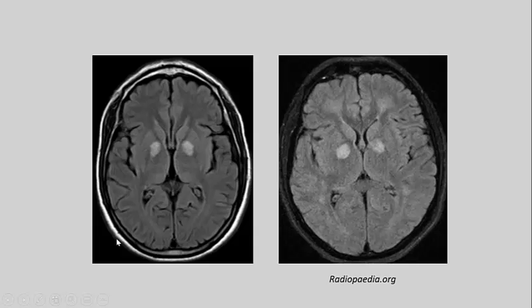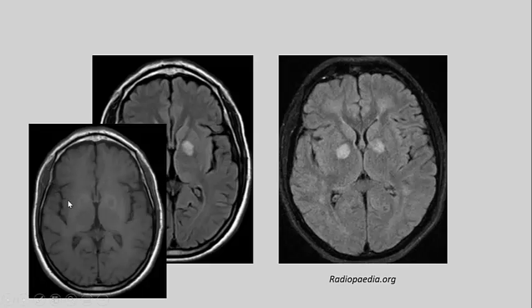But if I tell you that this patient is neurologically free, and he came complaining of some brownish spots on his trunk, and you look at the T1 weighted image, you find this lesion to be slightly hyperintense or with a hyperintense rim. They call it bright spots, or a new terminology is FASI, which is focal area of signal intensity, and we are dealing with neurofibromatosis type 1.